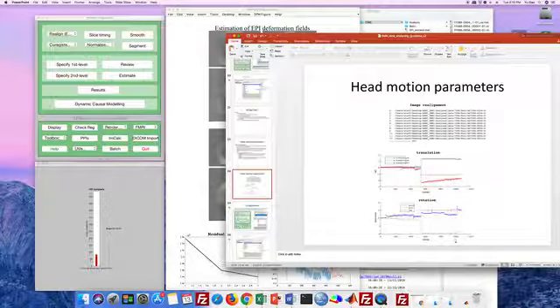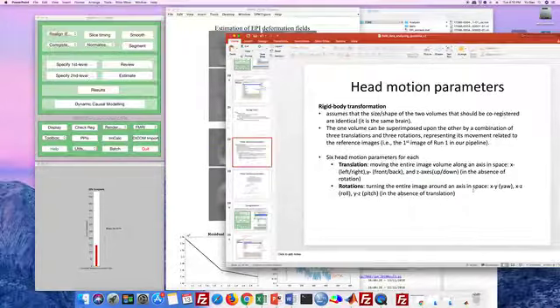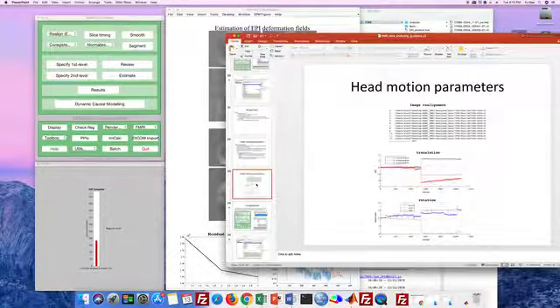That's very good. But for the location, right, in your dimension, the subject may move. The rotation is X and Z, right? May move a little bit, 2 degrees, but it's also acceptable. Means the data, and also you see within each run, it's very stable. Means the subject is very good.